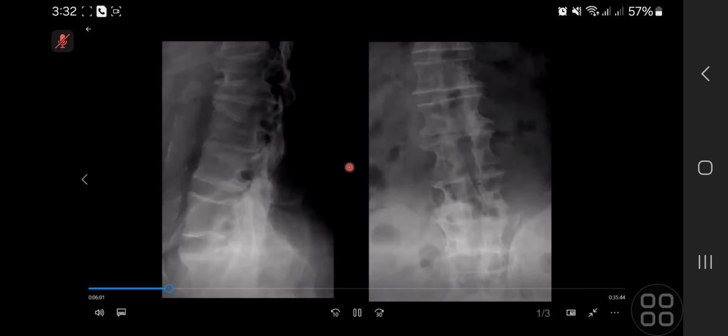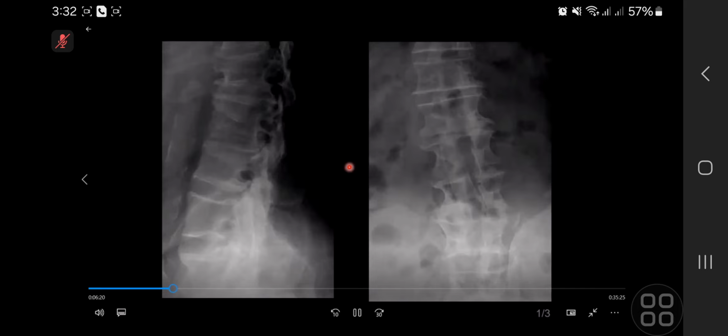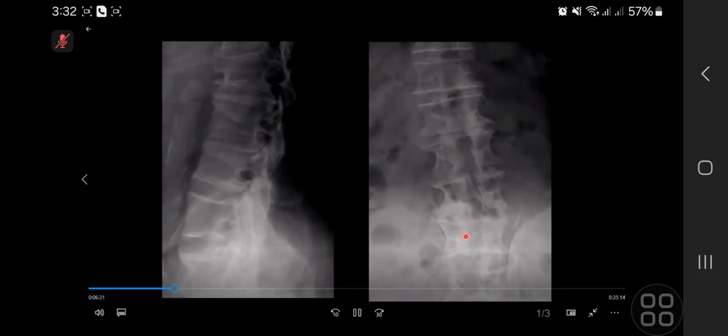Are they quite widely spaced? So your thinking is correct, and a slight bit of fine touch is needed. Spacing is what we are talking about. Is the spacing normal or abnormal? This is the discussion. So if you see the distance between this pedicle and this pedicle, yeah, it gets progressively narrower as opposed to getting progressively wider. So have you got your diagnosis then?